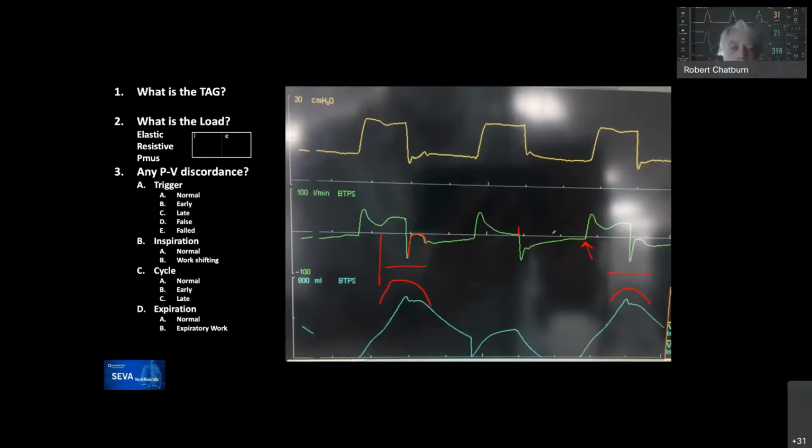This is a unique graphic because, as you pointed out, the middle breath is passive. And I think it very clearly shows in this case that the expiratory resistance is higher than the inspiratory resistance. You pretty much have to assume that the compliance is the same, but clearly the time constant is longer during exhalation. The only way that can happen is if there are secretions on exhalation, or maybe airways are collapsing. I don't know what kind of patient this is, but some kind of ball valving effect, clearly with 2 different time constants. Yeah, for sure.